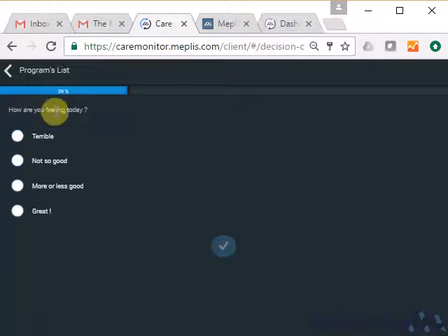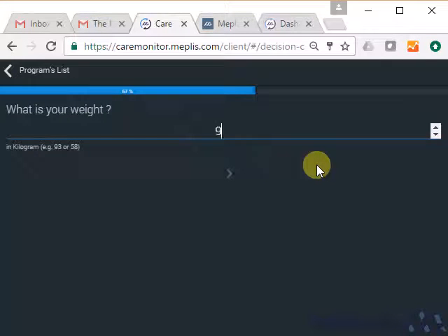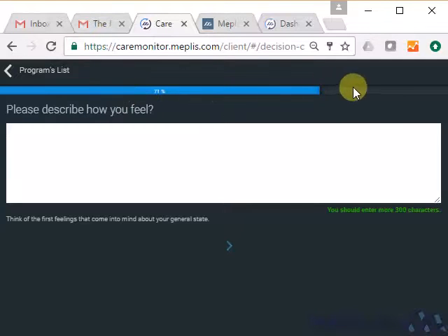So I can say, okay, how are you feeling today? So I can say, okay, today I'm really feeling terrible. So I can simply answer that, and I know that this is going to trigger one of my alarm conditions. So that's why I'm actually answering that. I'm not feeling terrible. Then I have these number questions that I have answered. So in years, please inform your age. So I'm currently 35 years old. So let me just answer that. Then I have to inform my weight, so I'm pretty heavy, I'm pretty tall, and so I'm 93 kilos. So it's in kilograms, so that's why I placed here the example 93. So you can see my progress bar is moving ahead.